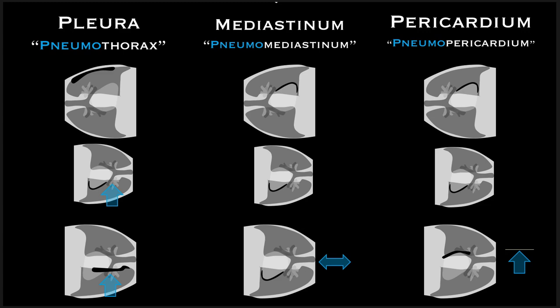Now, for the Mach bands, often they'll go away. You certainly won't see any redistribution. As you put that lung down, it's going to become more white, and it's going to be closer to the density of the heart. You'll often see those things just disappear completely.